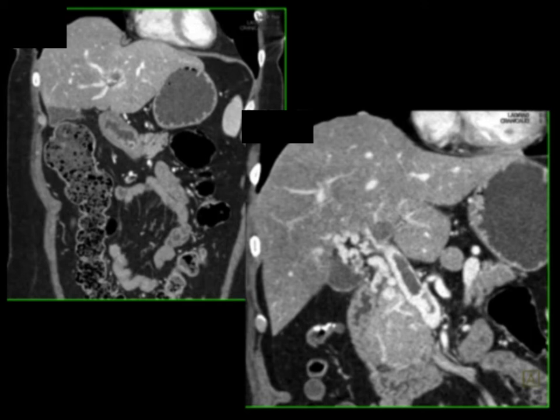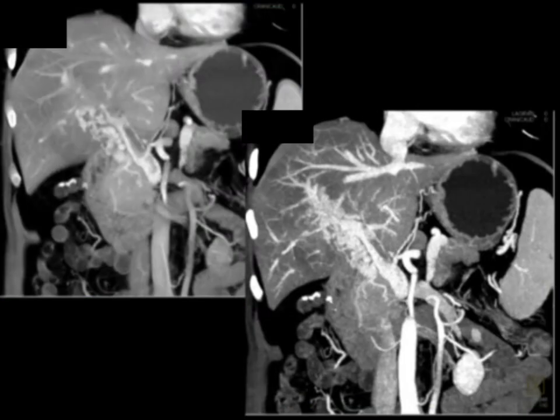If you didn't give IV contrast, if you weren't careful, you can confuse cavernous transformation with multiple rounded structures and suggest the patient has extensive adenopathy. So indeed, it's one of the pitfalls. MIP imaging, as you can see here, or volume rendering are very, very helpful in making the diagnosis as well and defining the extent of disease.